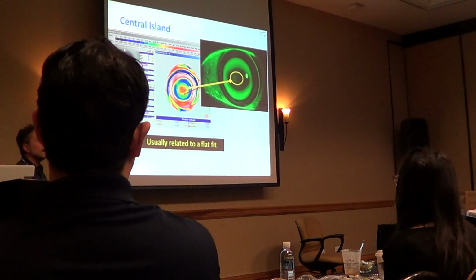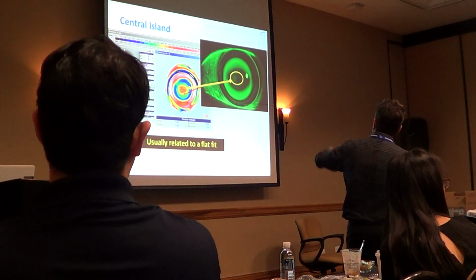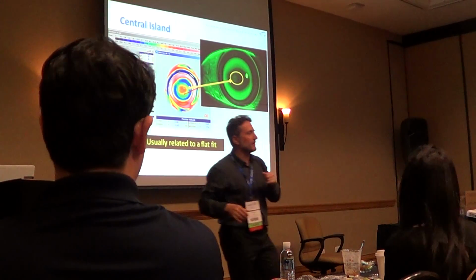That's Central Island. That's real. That's a real case. Yeah. That's a real case. On that last one? Last one? Before? Previous one? Yeah.